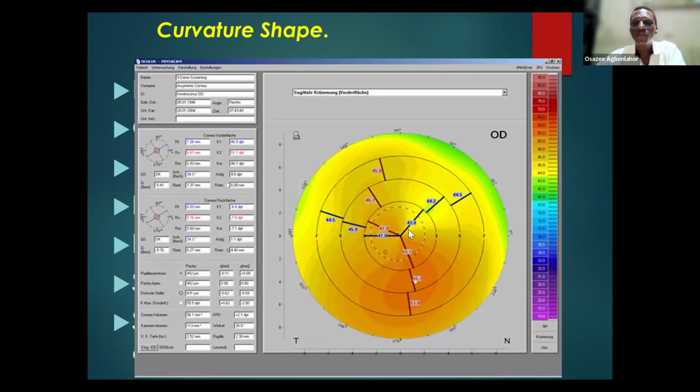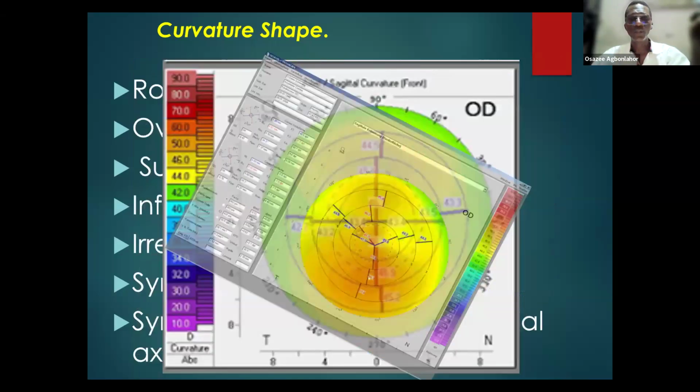But for you to know if it meets the definition of it being skewed, you must measure and see that wherever it's skewing to, the angle it makes when you draw a line straight here, if it's more than 22 degrees, then it's classified as being skewed, just like we see that first line and the second line. So this angle here that these two lines make, is it more than 22 degrees? If it's more than, then it meets the classification of it being skewed.